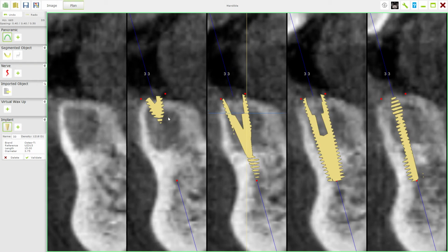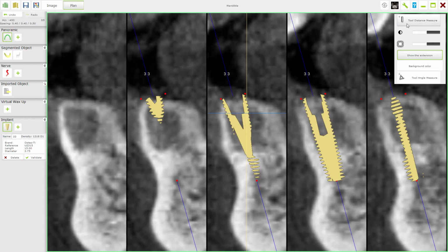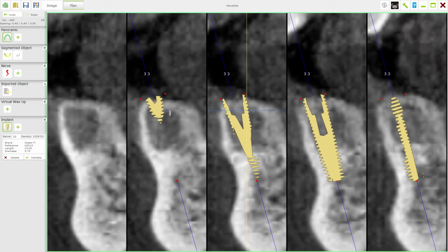So from about here I can click again, go to my measuring stick, click here if I want, and then I go to here. I can say for the next 6 millimeters it's going to be fairly plain sailing, and then I can click on here. But I can say after that, for the next 5 to 6 millimeters, I'm going to have to work, and I'm going to have to drill up. And not only will it give you an idea of what to expect when you're drilling the bone, which is very useful when you're a novice, but also what diameter of drill to finish with.